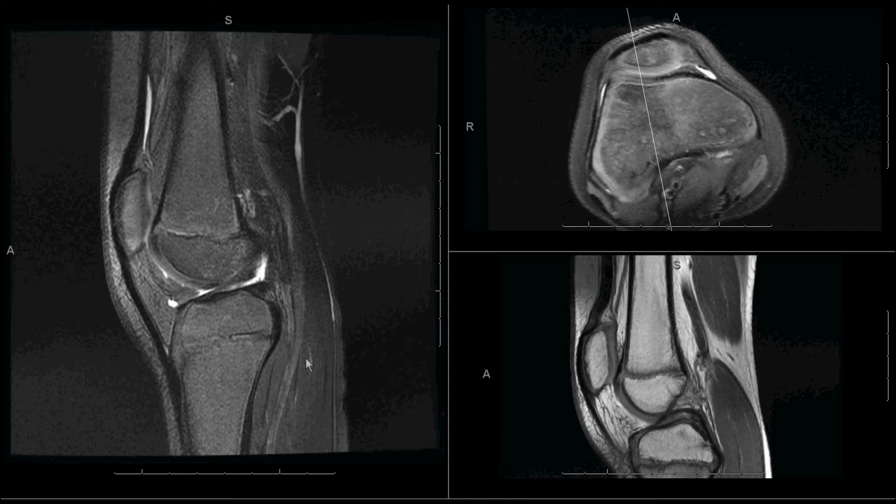Finally, looking at the soft tissues, including the joint spaces, is key. One needs to both identify fluid in the joint space and characterize it as either clear fluid, blood, fat with blood, the latter indicative of a fracture, or nodularity within the fluid, suggesting there's something other than just synovial fluid, such as synovial hypertrophy, or perhaps nodularity related to tumor or synovial osteochondromatosis or pigmented villonodular synovitis.